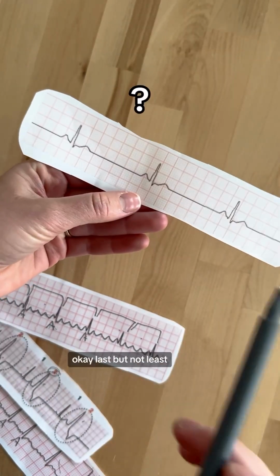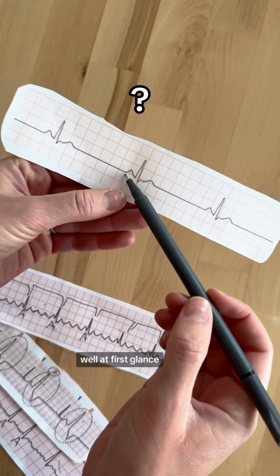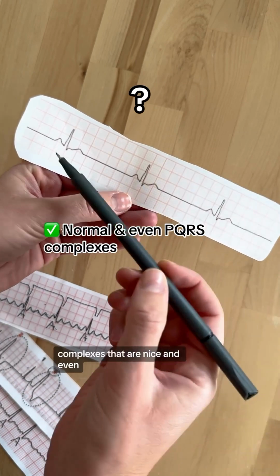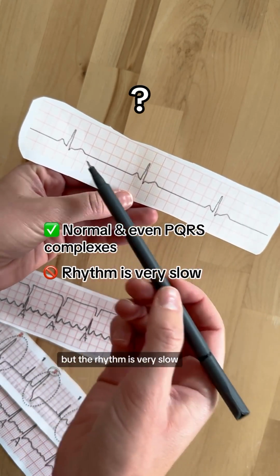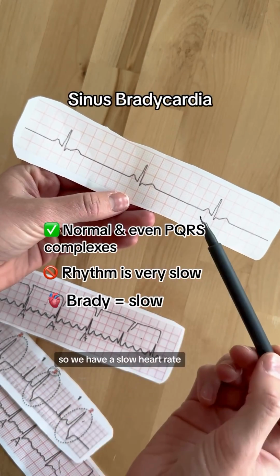Okay, last but not least is this strip. Does anybody know what this is? Well, at first glance, we have some really nice PQRS complexes that are nice and even. And we have a normal looking strip, but the rhythm is very slow, making this sinus bradycardia. Brady means slow, so we have a slow heart rate.